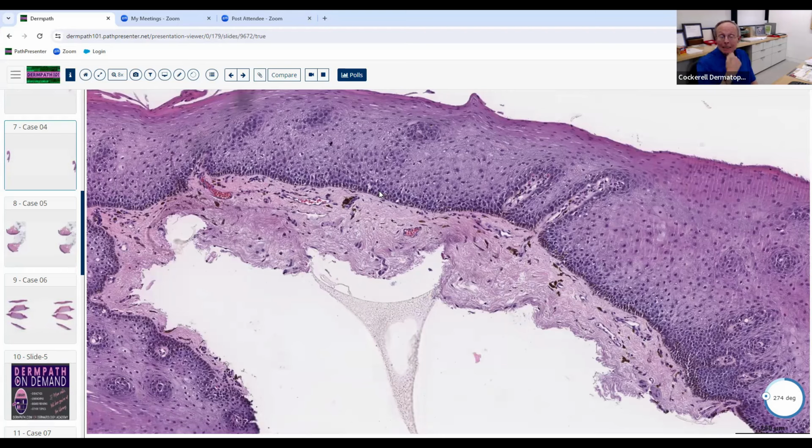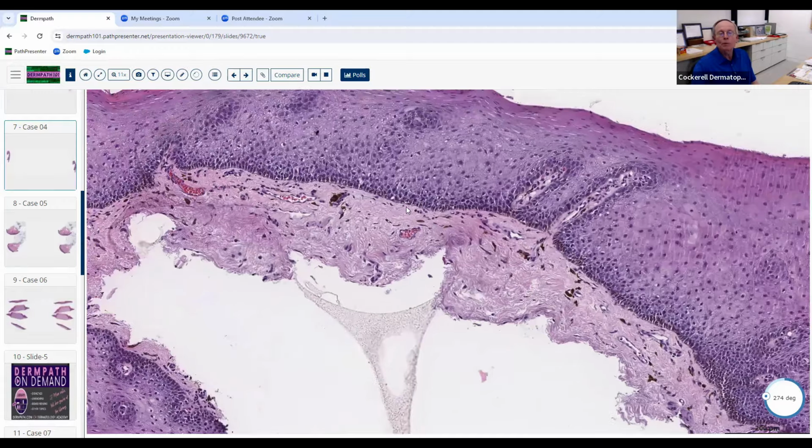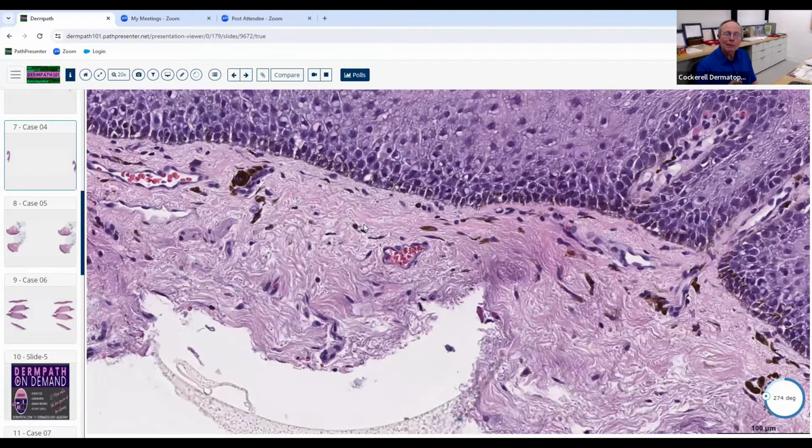We often see patients that get amalgam tattoos, which is basically mercury/silver amalgam. People that used to get their teeth filled when they were kids like me, they used to use those silver fillings. And every now and then the dentist would slip and stick a little bit of it in their lamina propria, and then that silver starts staining the elastic fibers. You can actually see the elastic fibers with the small granules of the metallic substance on there. It's actually an in vivo tattoo, a metallic tattoo. These are not metallic structures here. This is melanin and looks completely different.